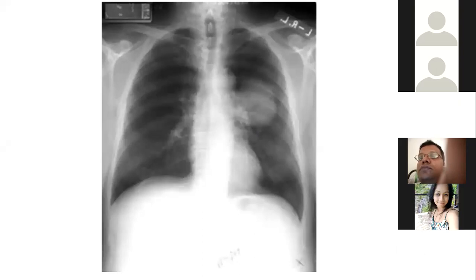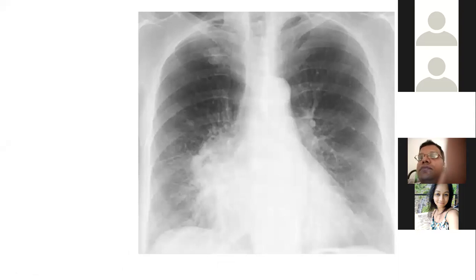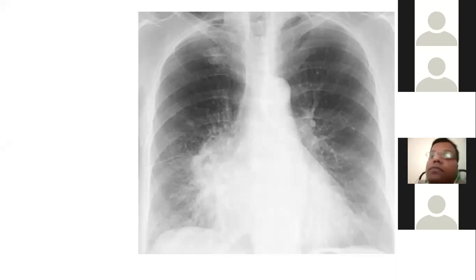Based on the acute angles, we decided it's a pulmonary mass, and here it's actually more obtuse angles, so it doesn't hold good all the time. But because of the irregularities along the lateral margins of the mass, there is definitely an infiltration into the lung, maybe along the bronchi, which usually happens with central malignancies like a bronchogenic carcinoma, squamous cell variety or small cell variety. So another point which may favor lung infiltration is the irregularity along the lateral margin.